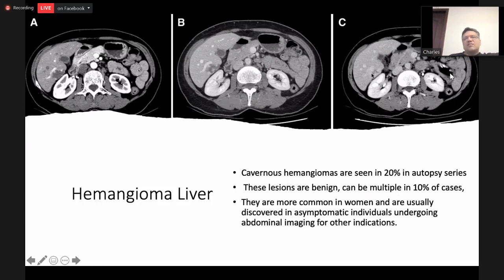And in the venous phase, again centripetal nodular enhancement. It's nodular, discontinuous, and the enhancement pattern is similar to the aorta. So the enhancement pattern in hemangiomas follows the blood pool, the same pattern as the aorta in the same phase.